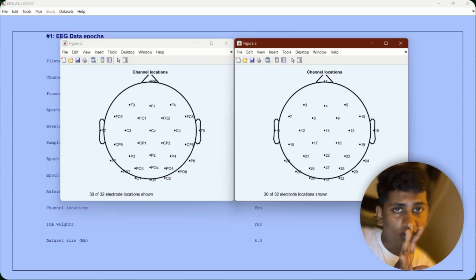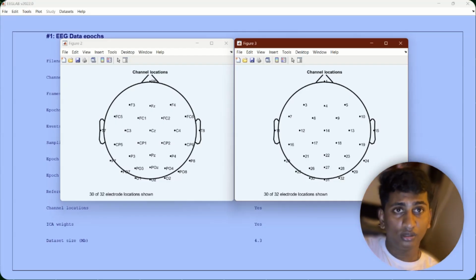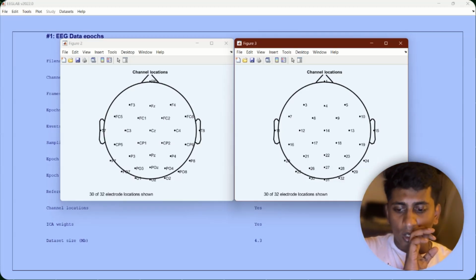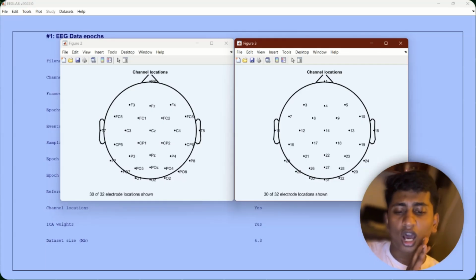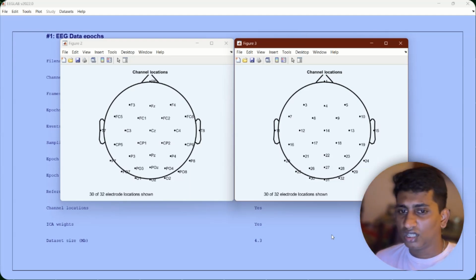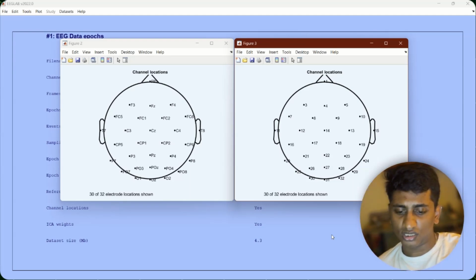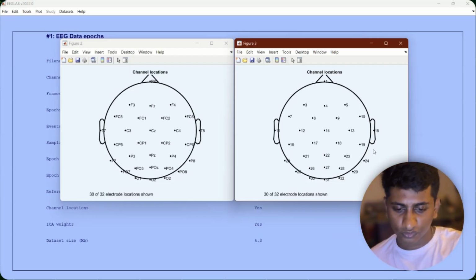Okay, so the parameter notes: for the interpolation grid, keep the EEGLAB default, a spherical spline, typically a 32 by 32 grid. This yields a regular 2D image. For the bad channel threshold, visually flag anything greater than plus or minus 200 microvolts. Long transients or flat lines will be marked for removal, like 5% of bad samples will be removed, even though only 30 electrodes are there.